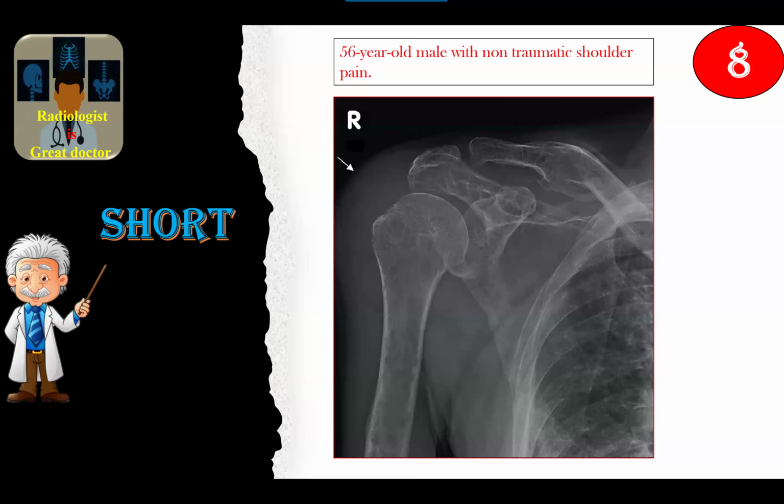Old patient, non-traumatic shoulder pain. Multiple lytic lucent lesions throughout the visualized bones, also reduced bone density and some healed fracture of the clavicle. I am concerned; differential would be multiple myeloma or mets, and I would correlate my findings with the history of the patient and other studies if available, and discuss with the clinician.